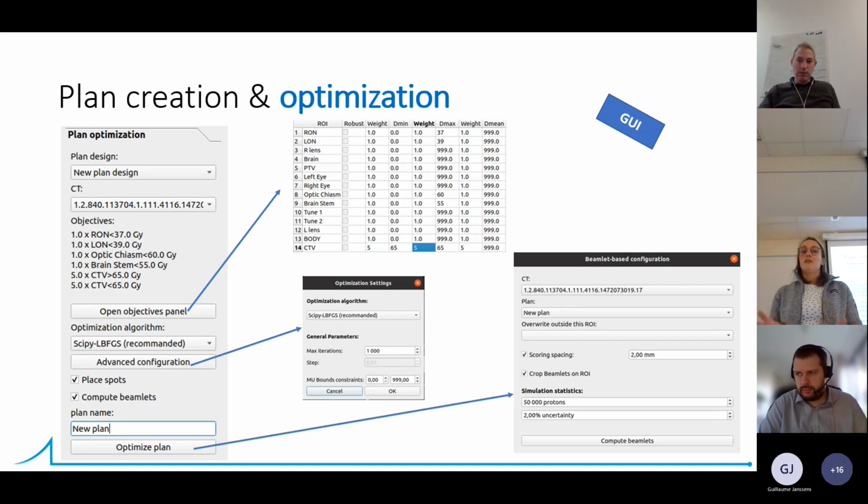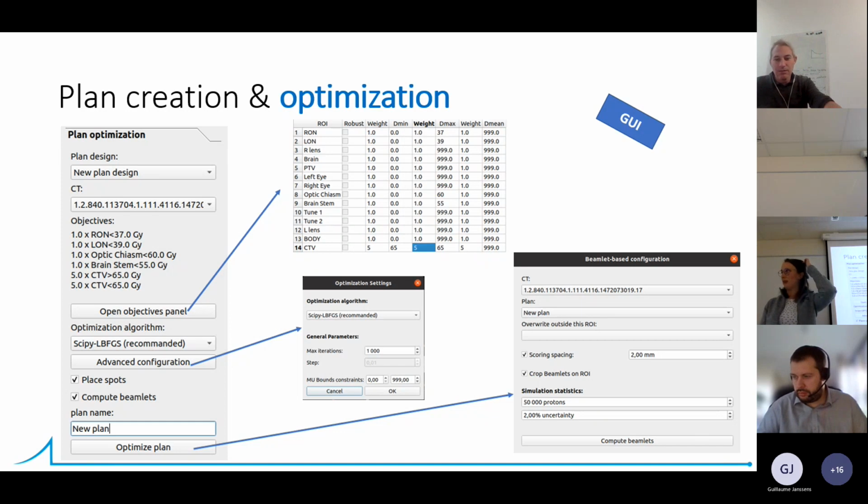At this moment, the GUI will again freeze. That's normal. Depending on the IDE that you are using, you will see something in the terminal or not. In PyCharm, I see the simulation of each beamlet, but I know that in Spyder, we were not able to see that MC² output. So it's something linked with C code or something. But just wait.